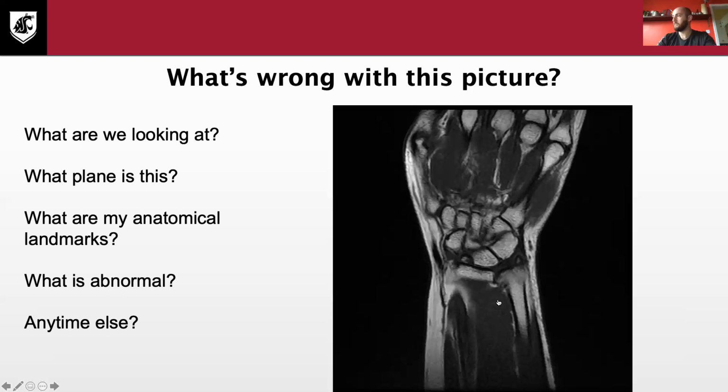And so what are we missing here that I showed you guys from the last image? Big break right here. So what type of abnormality is this? There's a scaphoid fracture, nice. Pretty significant, pretty concerning, but that's something that's really detected better on an MRI.